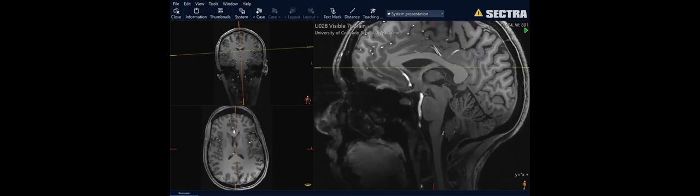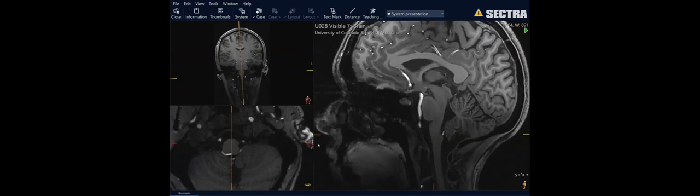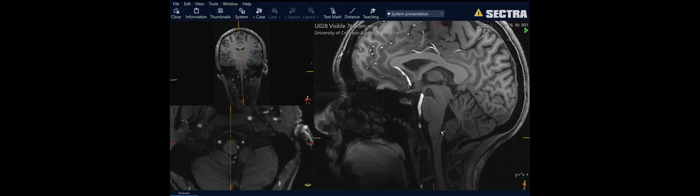And if we're looking at that midline, we probably have here the gracile fasciculus, gracile tubercle, and a very small and very faint central canal of the spinal cord. So that fourth ventricle exiting by the median aperture, but also becoming continuous with the central canal of the spinal cord.